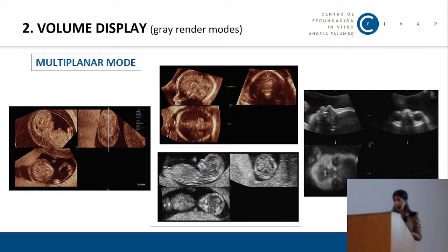In particular, it enables the correct presentation of the median plane of the embryo or fetus that in the first trimester is important for the correct demonstration of the measurement of the nuchal translucency, nasal bone, or face anomalies like proboscis or retrognathia.